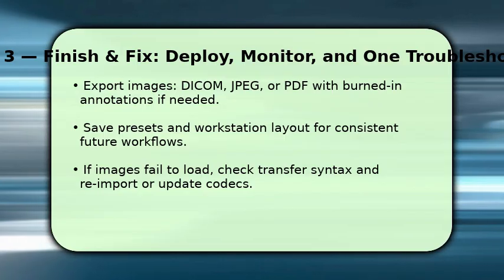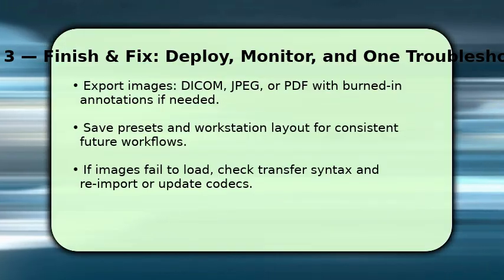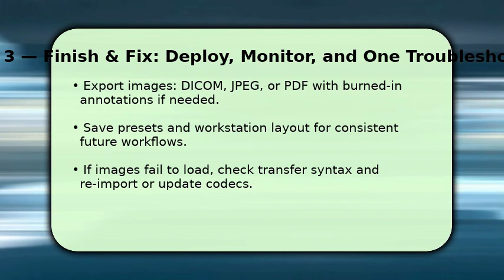If something goes wrong, like missing slices or unreadable files, check the transfer syntax and codec settings, re-import the original files, or update the viewer's DICOM decoder. One quick troubleshooting tip. If thumbnails are blank, rebuild the cache. This often fixes indexing errors.